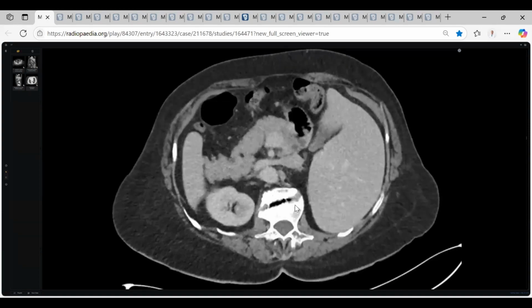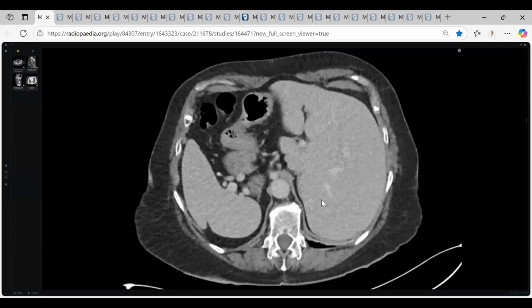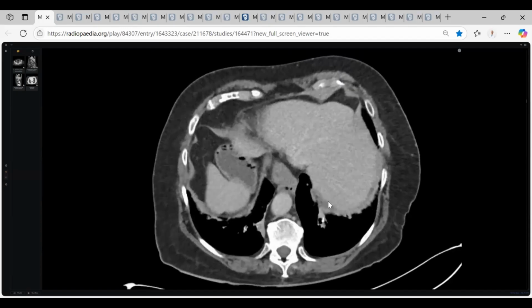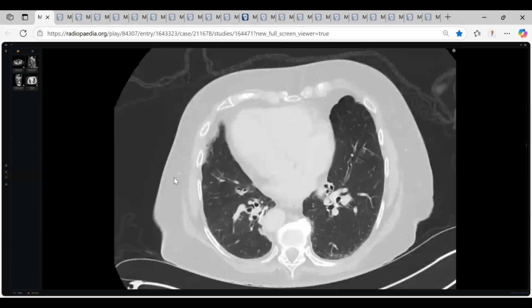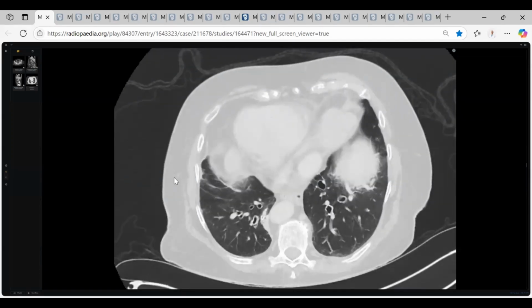review the lung window. If there's bronchiectasis of the lower lobes, then I'm concerned that this patient may have Kartagener syndrome. Lung window for what? From memory, there appears to be situs inversus, but I just want to make sure there's no lower lobe bronchiectasis, because otherwise it could be Kartagener syndrome. But if there's no bronchiectasis, then I would say this is just appendicitis. What do you say?